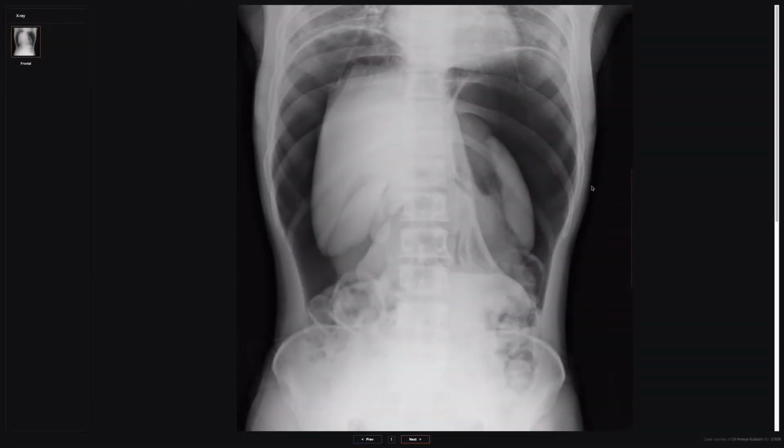Now, you will all have heard of tension pneumothorax. There is an entity known as tension pneumoperitoneum, which is incredibly rare. Here is one example. And essentially, it's similar to what you get with tension pneumothorax, which is one-way inlet of air into the peritoneal space, but it's got nowhere to go, so it then builds up the tension.